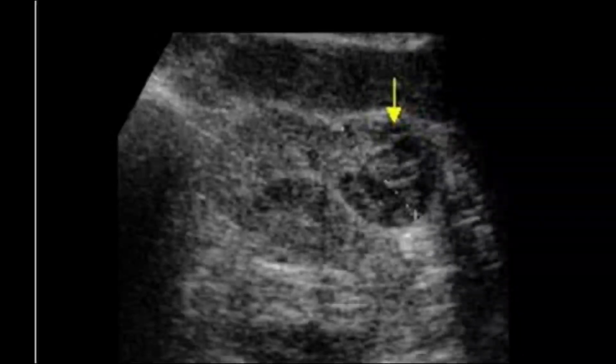However, very little cystic component is visible, all intranodular soft tissue, thick wall, thick nodularity can be seen. So this type of cyst will be considered not a cyst at all, rather a malignant cyst. So raise your suspicion and refer it to the surgical department for further workup.